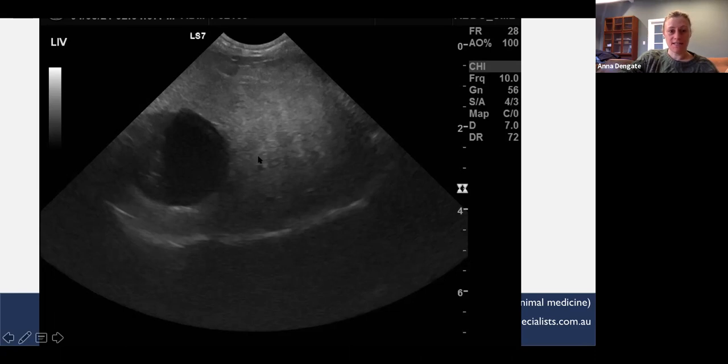With echogenicity, I agree that it's mixed, absolutely, and I agree it's probably generally a little bit hyperechoic, but we don't have the relative spleen or fat or renal cortex to say that definitively in this image. And the gallbladder, how do we assess the gallbladder? We didn't talk really about that. What things are you going to want to notice in the gallbladder?